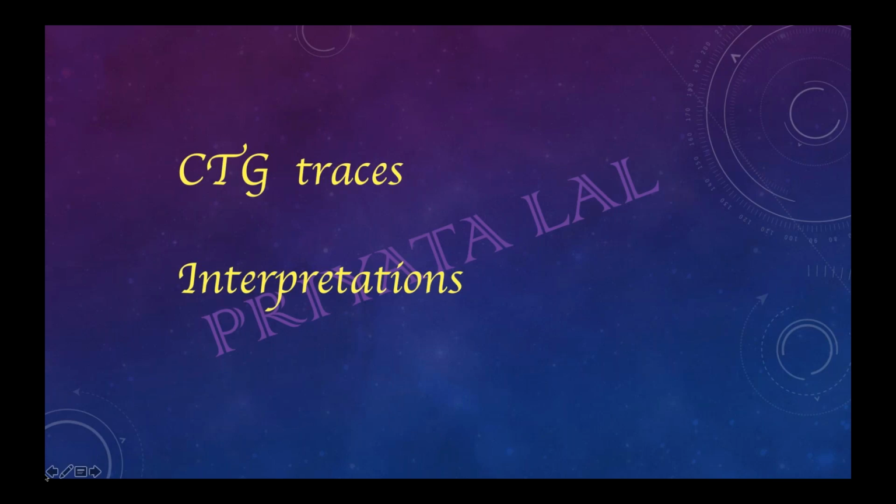So does anyone have any question, or do you want to go ahead with the interpretation? Ma'am, one small doubt. In the guideline, they have given one line like even if the variability is reduced, but there are accelerations, then it is a normal CTG. I did not understand that. Okay, in any trace, if you find any non-reassuring feature, but on the other side you are seeing acceleration, then we are happy, no need to do anything, the baby is doing okay.